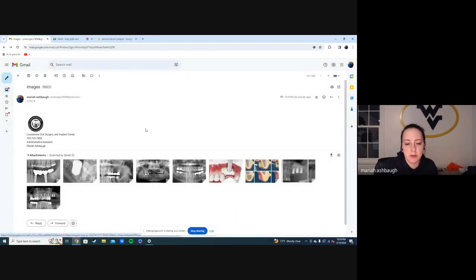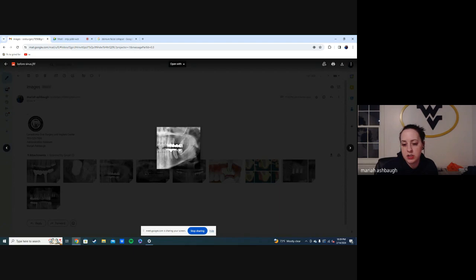We talked about the bottom, the concern being our nerve. On the top, our concern is going to be our sinus. Like we had discussed, when you take a tooth out, if you don't have that tooth there to stimulate the bone, you lose it. In this x-ray, you can see the sinus comes here and drops down.